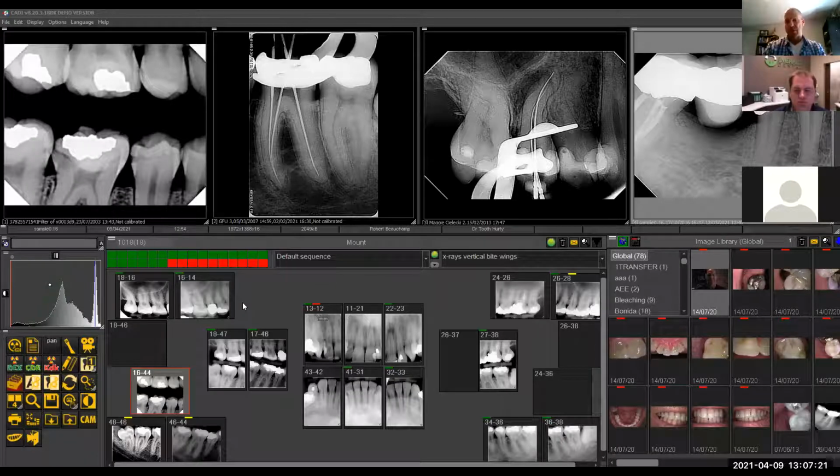So I have a doctor up here that got into Botox. So he wanted a whole layout for Botox pictures that he takes before and after. And this is all customizable. So, and I'll show you kind of what I have here in respect to my demonstration. But in your practice, you can develop as many mounts as you'd like, and you can set them up the way you'd like as well, based on the images you're taking.